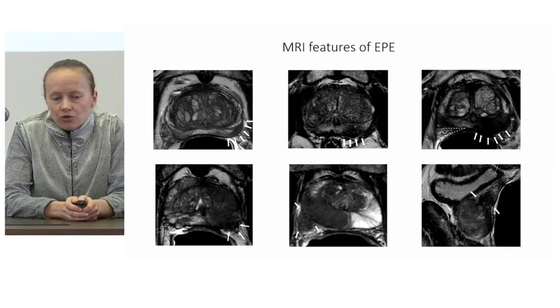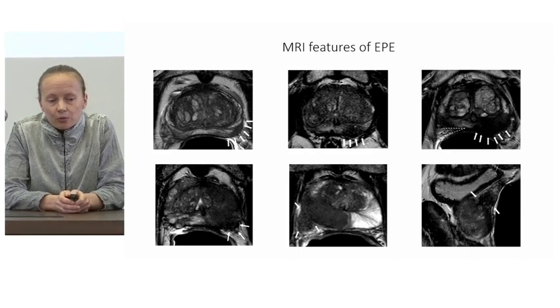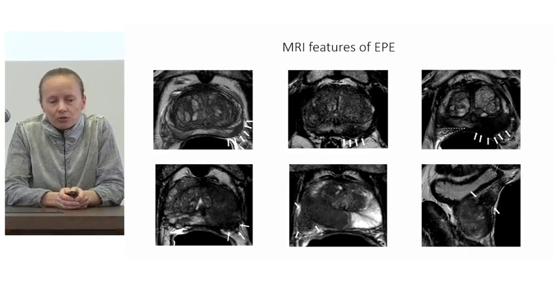And to know our dragon better, we use T2 sequences on MRI, and we're looking for broad contact between tumor and capsule, capsule bulging, or invasion of the rectoprostatic angle, or neurovascular bundle asymmetry, or direct extension to neurovascular bundles or direct extension to seminal vesicles.